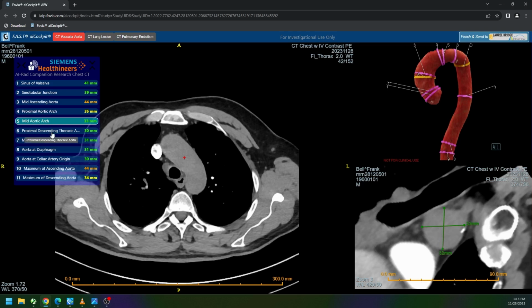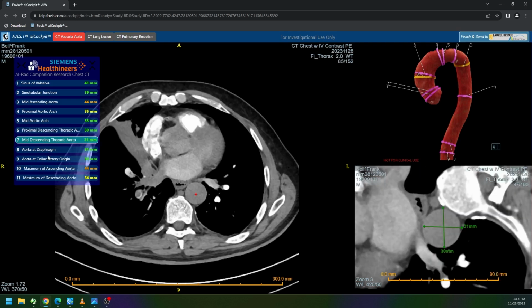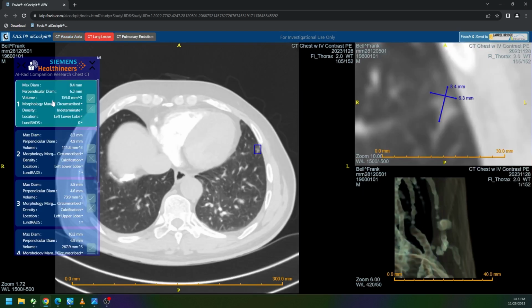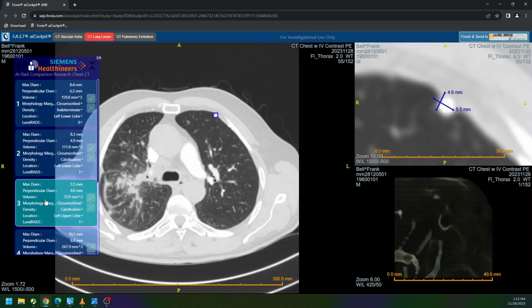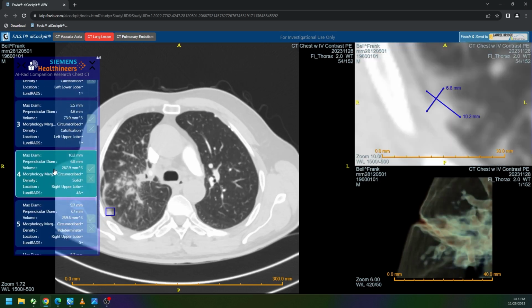Other incidental findings include finding a pulmonary nodule. So several pulmonary nodules have been identified by the Siemens Healthineers AI-Rad Companion. We can go through each of these pulmonary nodules that have been detected and decide whether they are true pulmonary nodules or whether they're atelectasis or calcified granulomas. Note that all the descriptors that describe these pulmonary nodules, including size, shape, margins, all follow terminology from RadLex, a standard lexicon for describing radiology findings.